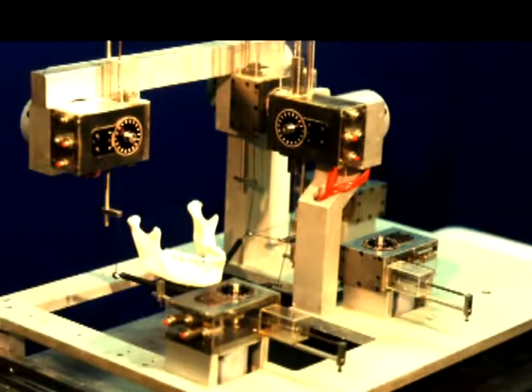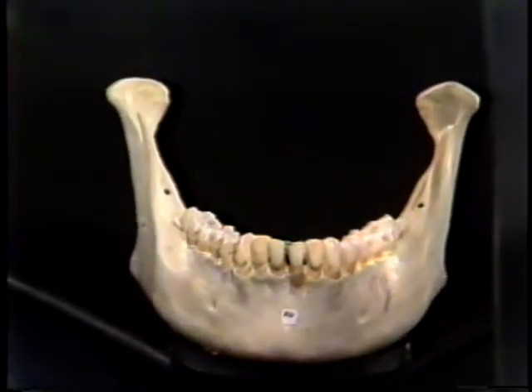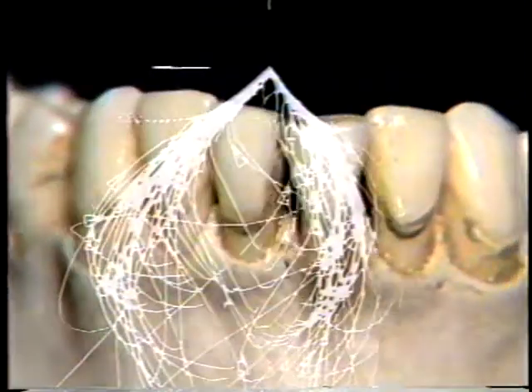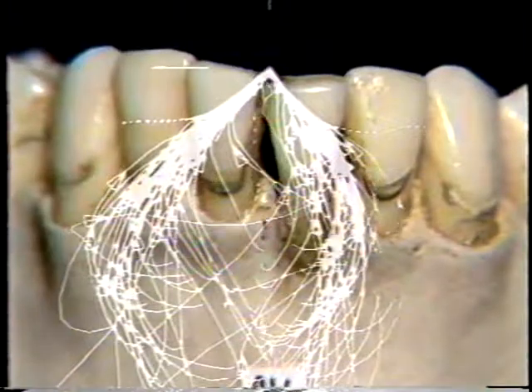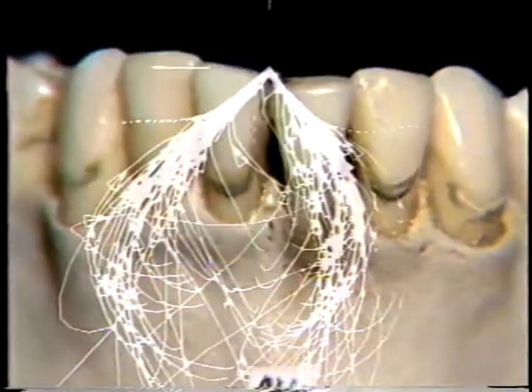Also, a mandible oriented to the subject's coordinates helped visualize movements of selected points. Here the incisor point is tracked with the aid of a small metal sphere from a ballpoint pen glued between the incisal edges of the two incisors. A previously recorded frontal plane incisor point plot of this subject is suspended over the display mandible, which is being moved by the same chewing data.